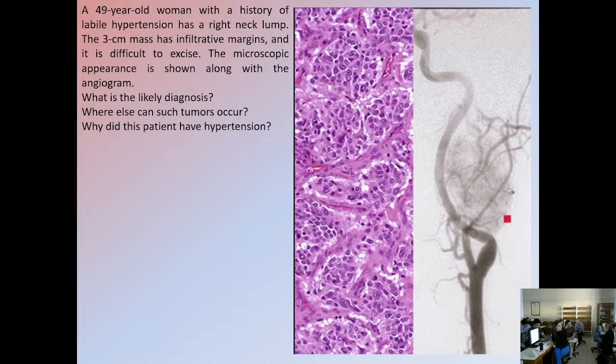What differentiation is suspected? Because this forms a category of neoplasms which can be either benign, like this one, or malignant, like other neoplasms. And they have homogeneously appearing cells. The cells look like each other generally in low to medium magnifications. What differentiation is expected if you see such homogeneity in a neoplastic cell population?